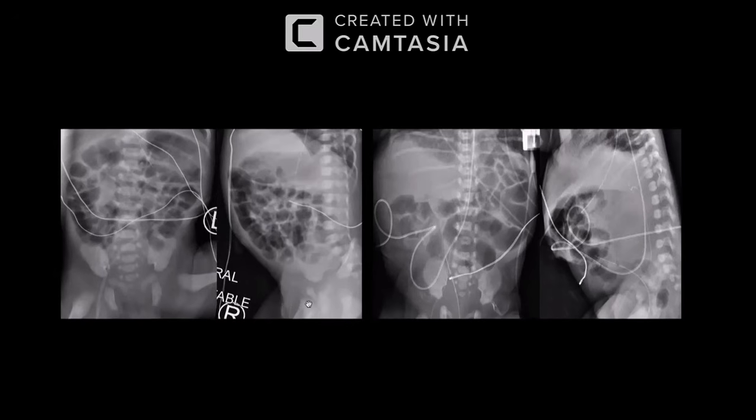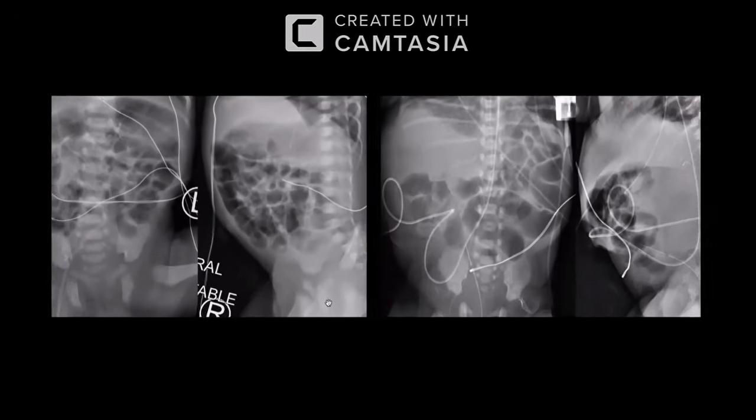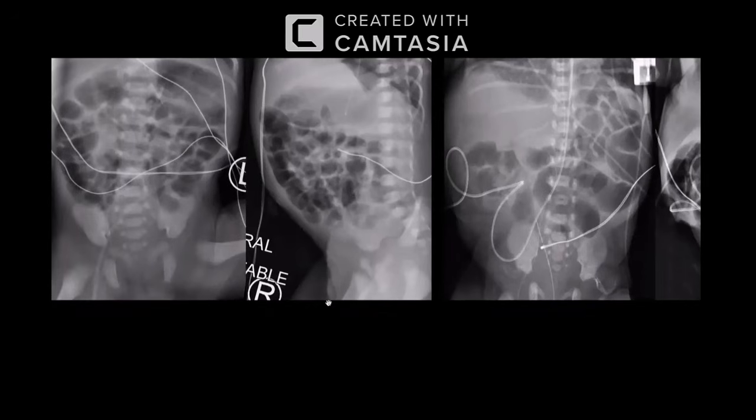Sometimes you may get confronted with pediatric x-rays and be asked about the catheter position, so you should be aware of that. You can actually see a thin catheter going here. On a lateral radiograph, it is very much evident. You can appreciate this. Just follow my cursor.